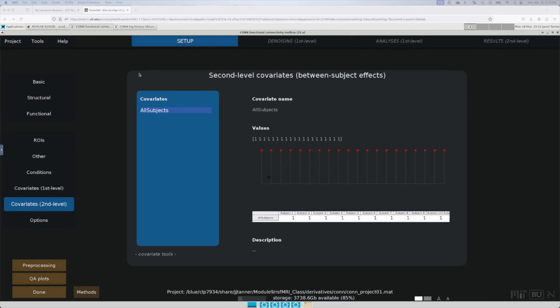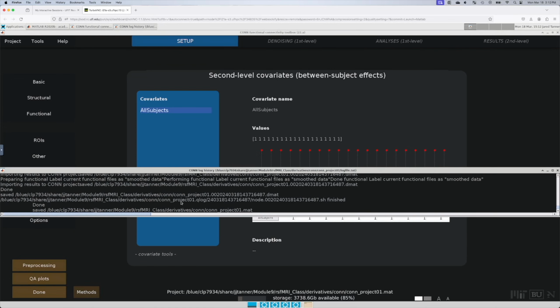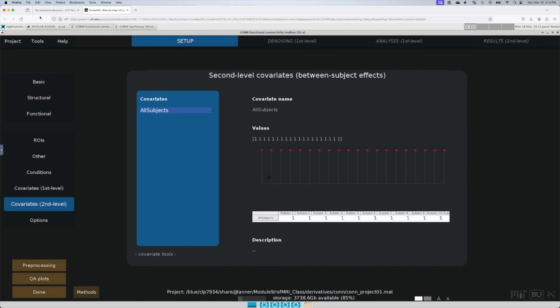And so I closed that window and I got a little notification that said the job is finished, would you like to merge the jobs? Essentially what it does is it split it all up into 20 different jobs, and then you want to merge them all back. And so those are done. It said here that happened, it finished and everything. The other thing I do want to recommend is regularly saving the project. It does save when you do steps, but get in the habit of project save, and that will help prevent any issues that might happen if this crashed.